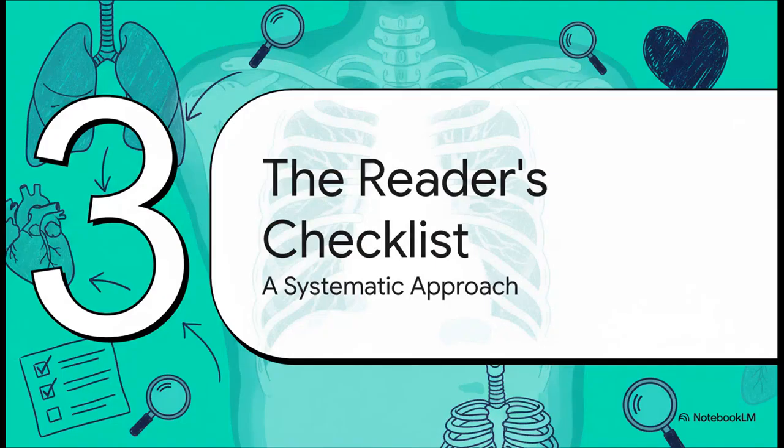Okay, so we've learned our alphabet, we've checked the quality of the picture, now it's time for the secret weapon, a system. Having a checklist is what makes sure you look at everything, every single time, so you don't get sidetracked by the first thing that catches your eye.